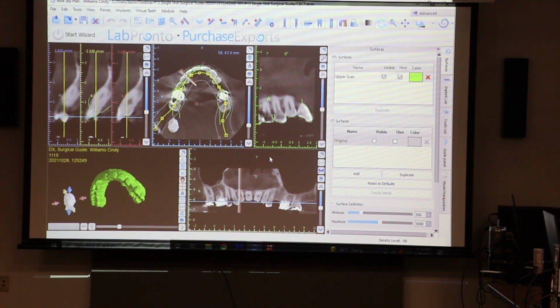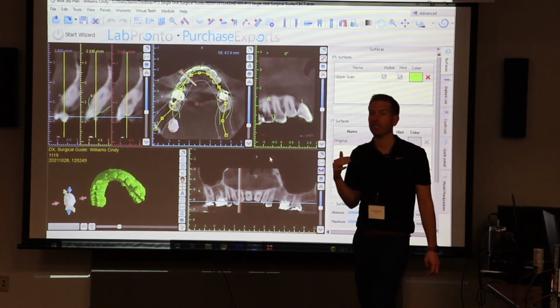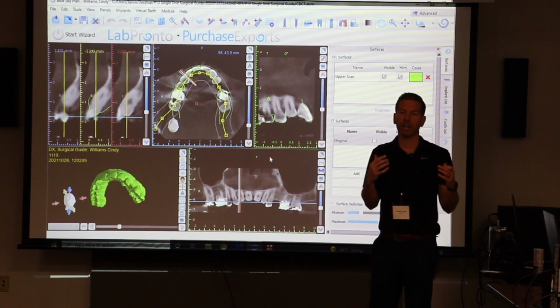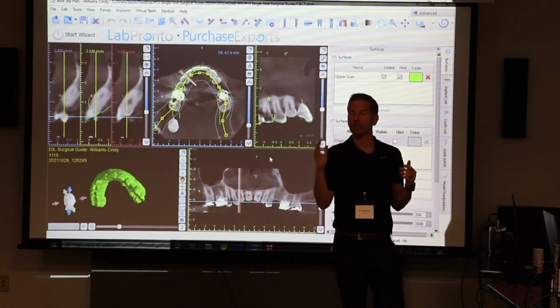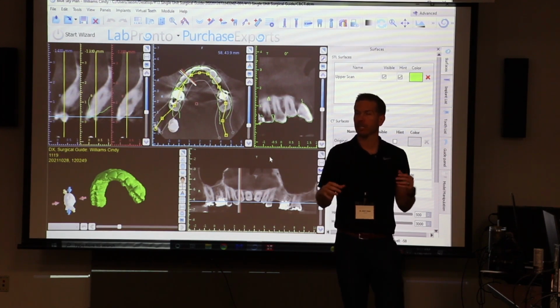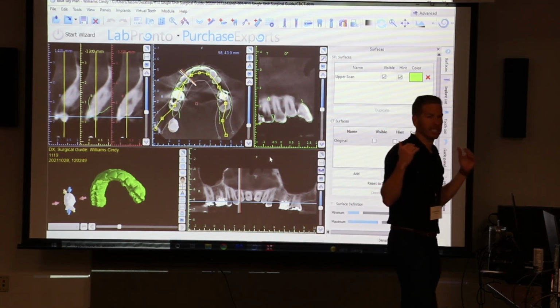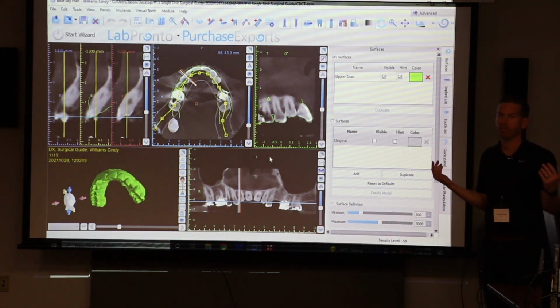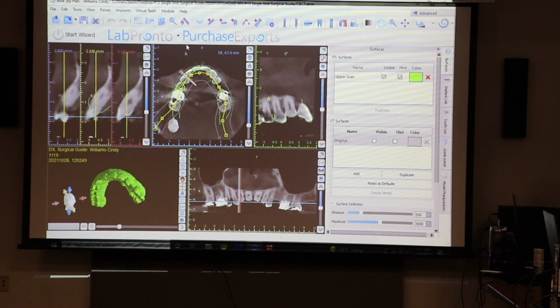Now, we talked about before tooth-driven, prosthetically driven dentistry. If we have a critical area where prosthetically driven dentistry is super important, like up in the anterior, we usually want to start by bringing a tooth in first so that we know this is our planned tooth and we support that. I want to walk you guys through this. It's an easy case, a posterior tooth. It's straightforward, a slam dunk. There's bone, and we all know where a premolar implant should be. So for this first case, we're not going to put a tooth in first, because we just want to do a simple surgical guide and get you guys through this.